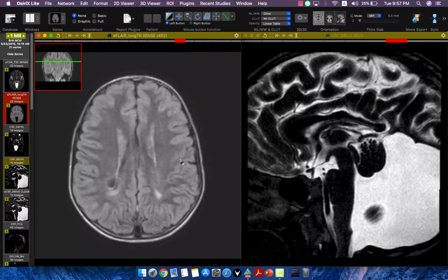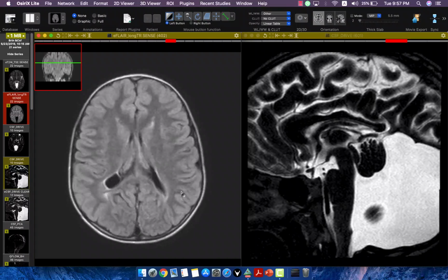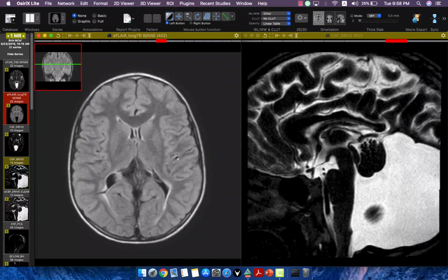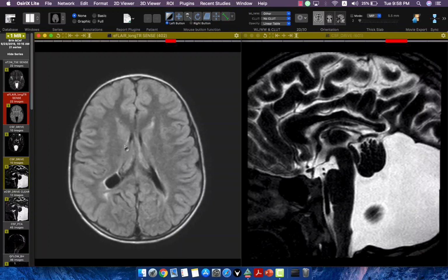There is a residual minimal periventricular high signal that reflects CSF permeation, and the shunt tube is an indication that there was a hydrocephalus. There is no more hydrocephalus because the shunt tube is applied.